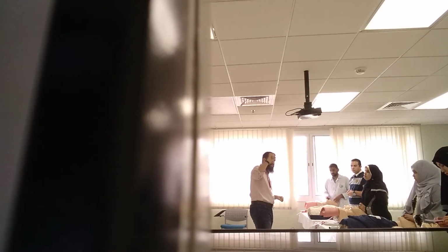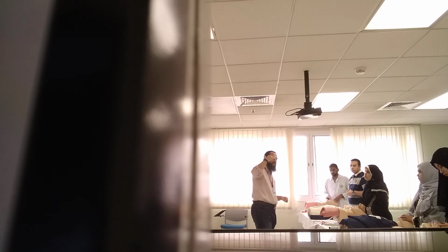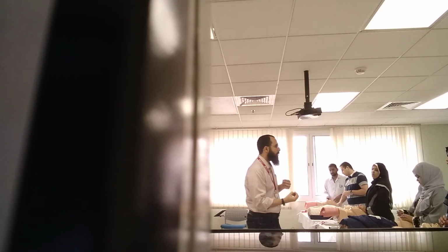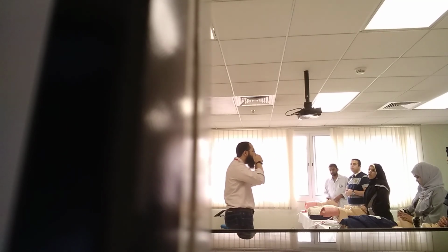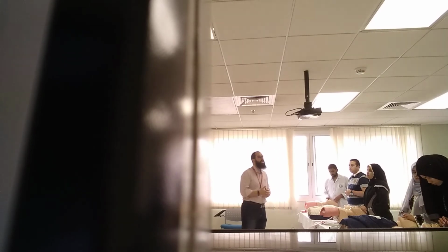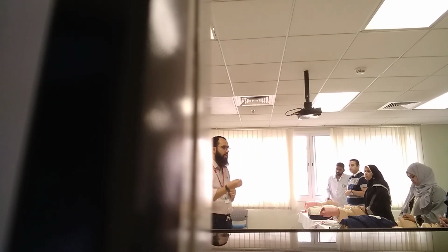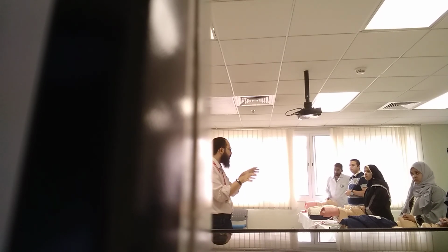So if you have a cervical injury, a skull base fracture, or trauma to the head that you suspect, or you saw the patient having secretions or CSF fluid oozing from the nose or the ears, now you suspect a basal skull fracture. So don't use the NPA. Same, also don't do nasal suction. This is how you balance your options. If you don't have that risk, then you go for the NPA.